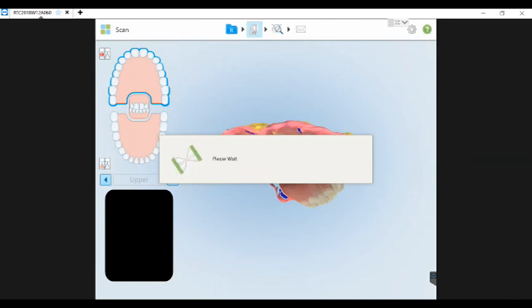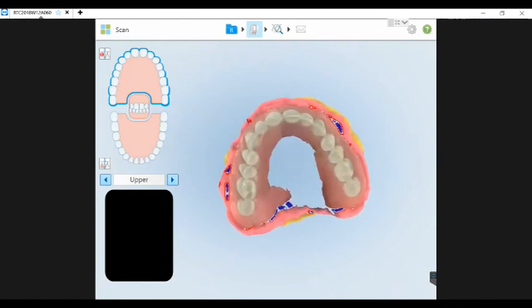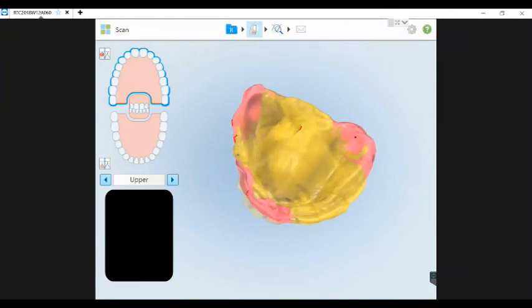If we don't have any other questions specific to something on my scanner, I want to be respectful of your time, of course, and stop the share and go back to the PowerPoint. Oh, look at that. It's done. So like these little areas here that are now encircled in red, if that was in the intaglio, you could pick that up. So pretty cool. Wonderful. So let me stop the share on that one, and then I'm going to reshare back up.